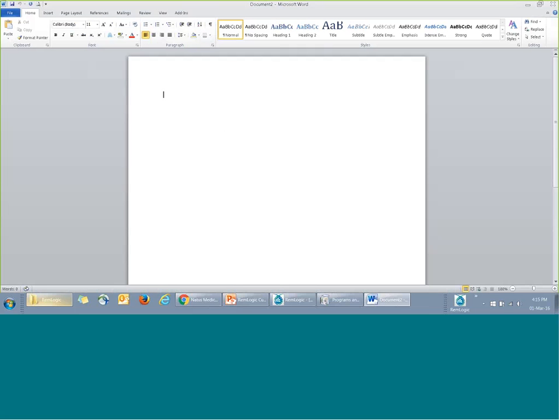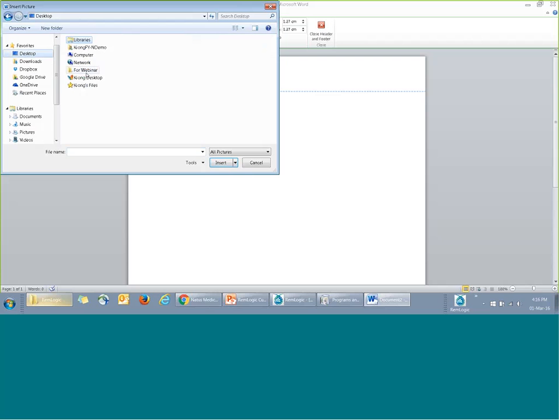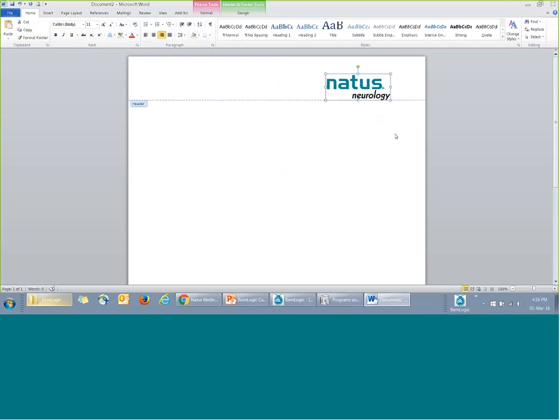Okay. So first and foremost, this is Microsoft Word. You can actually plug in any logos that you wanted, or the logo of the hospital. I can just click here, insert the picture. Okay. I can just put in one logo. Okay, maybe just a little bit bigger. And put it on the side here as my header. Then you can start to put in the patient's name, patient's ID, date of birth. I've done some customization of reports before, and I always like to put it in the format of a table so that it is arranged nicely in the format.